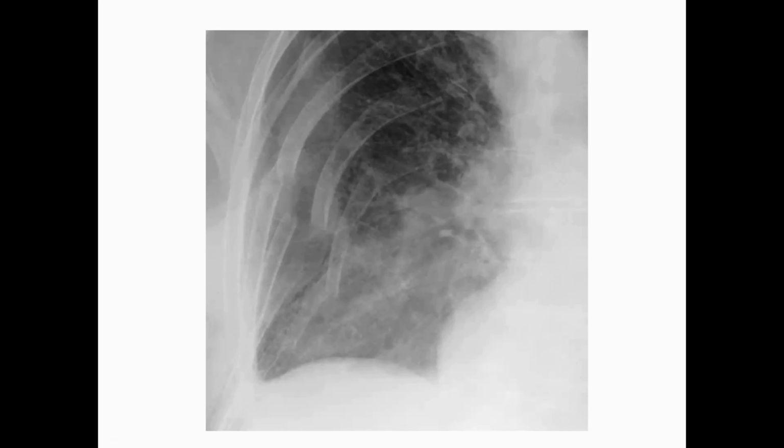Here, if I tell you the clinical feature, really the clinical feature is very, very important to consider before interpreting. So this patient came with a history of blunt trauma to the chest wall, just a few hours ago, okay? And this is the chest X-ray. So how are you going to interpret this?